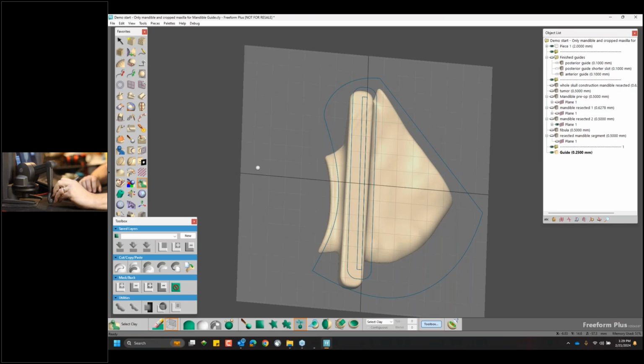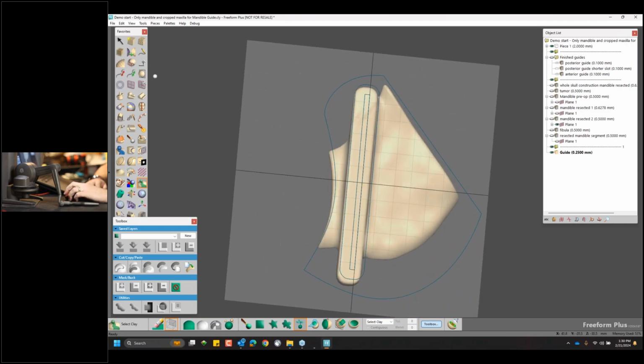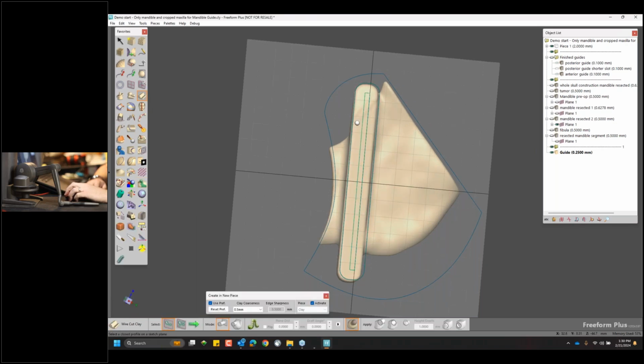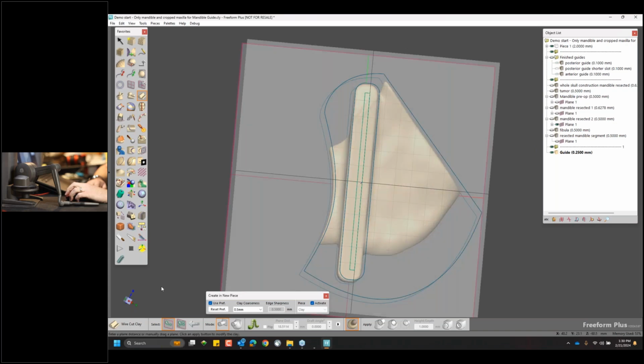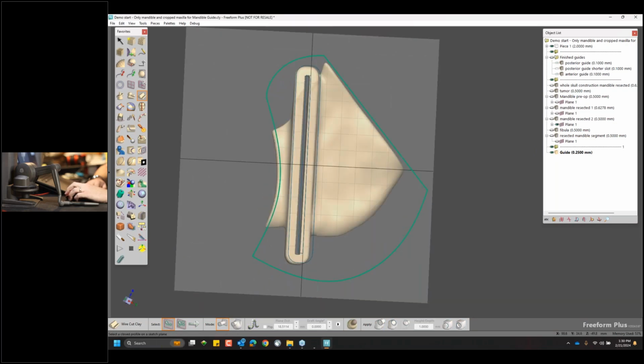I'm not sure what happened. I seem to have lost my haptic device. I think I may have bumped the hub that I have. So for the moment, just to finish this, I will do this with my mouse and then I will reconnect my device, which will only take a moment. But I can trim this, select that slot, turn off create a new, and remove that out.